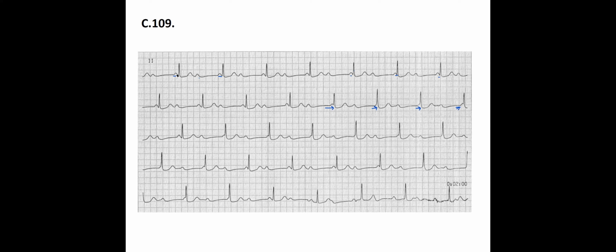It works independently, because if you had any kind of conduction that made it arrhythmic, it would be a high degree. So this is why I said at the beginning, look at the rhythmicity. If we have a first degree AV block, that's rhythmic because every P is followed by the QRS complex. If you have second degree, when we do not have conduction, that makes it arrhythmic. High degree, again, it's arrhythmic because we have an escape rhythm. Yes, it's rhythmic, but whenever we have a conducted beat, that makes it arrhythmic.